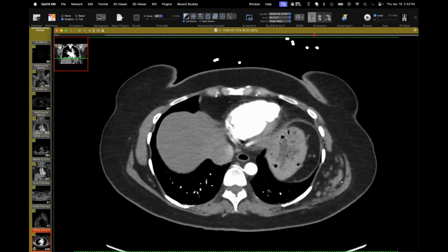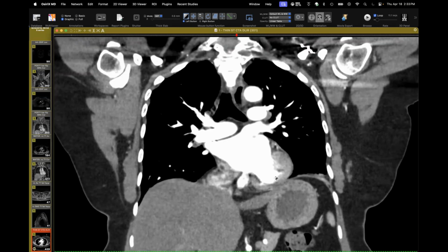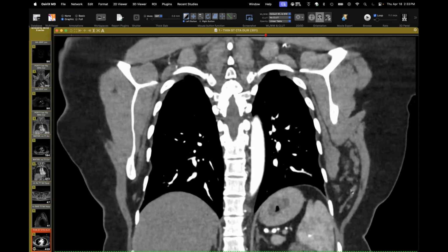So Jeff, would this have been called a venous tumor before? Like some sort of angioma? Yeah, sometimes they got that name, or a venous malformation. But I think the term we use now is low flow or slow flow, as opposed to a true AVM that has very turbulent flow, like you might see in the brain where it can cause big problems. These generally don't. They don't embolize, and they're just there. And if they involve the skin, of course, they can have the funny discolorations. But this is what it looks like. It was curious because it was in the right location for an elastofibroma dorsi, but it's not. So we shouldn't consider this a vascular tumor, we should consider a malformation.